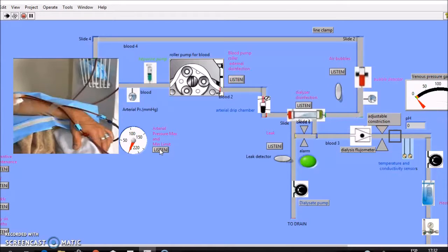Arterial pressure, maximum and minimum limit. Possible cause: simultaneous actuation of this error with a dialysate or venous pressure related error. Folding or occlusion of the blood line between the venous drip chamber and patient, or occlusion of the line with a rubber clamp. Thrombus formed at the mesh of the arterial drip chamber. Action: remove thrombus or replace blood line with a new one.